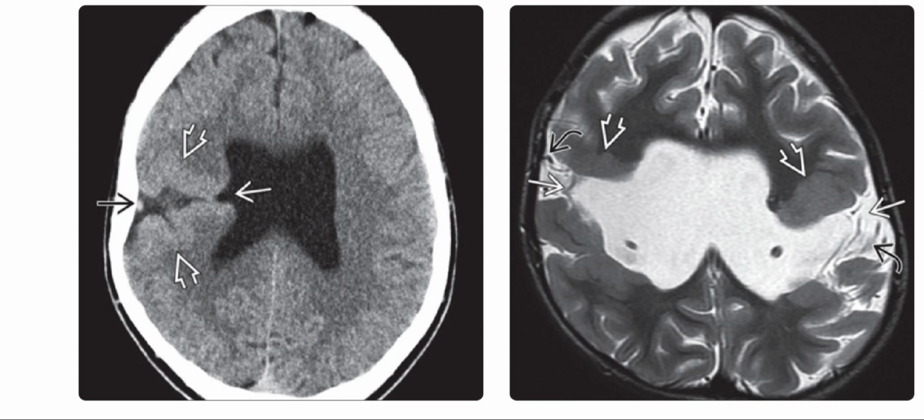In the right image, we can see that that's the axial T2 weighted MRI, and it shows bilateral schizencephalic clefts which are lined by dysplastic gray matter. Note the abnormal cortical veins associated with the clefts.